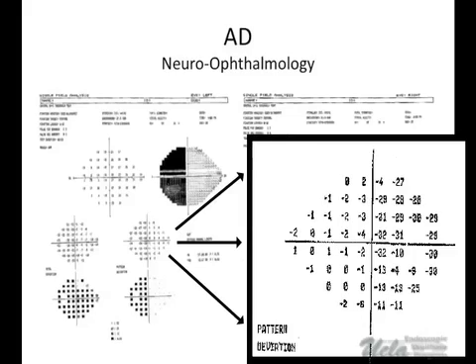Go ahead. What do those numbers represent? We see somebody maybe with, instead of a 20 in there, it's 40? What's that? Yeah, I would say if you're not looking at fields a lot, the actual numbers are not that valuable because you don't see it that often. But these probability plots are nice.